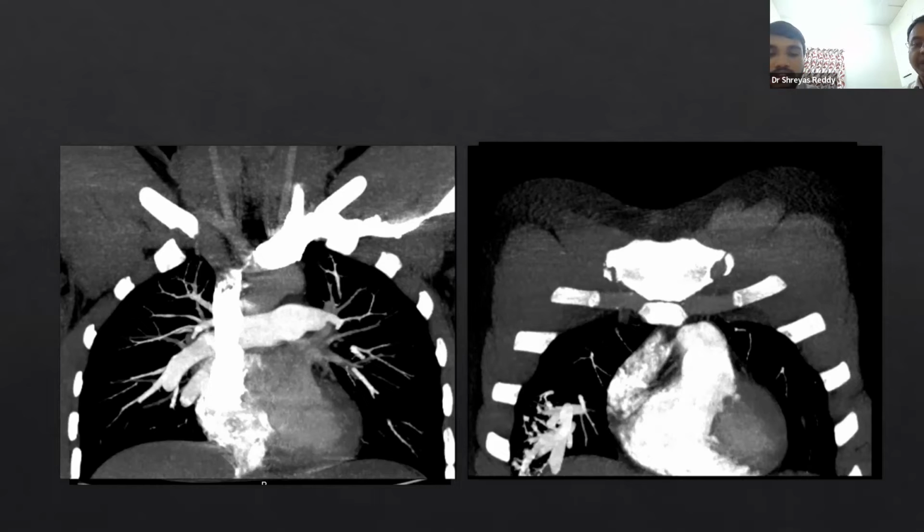What are the other areas where it is called an AVM but is not actually an AVM and is a fistula? Uterine AVM is not a uterine AVM per se, it's an arteriovenous fistula. Okay, perfect. Can you go on to the next image? You can see beautifully here. Can you identify the structures?